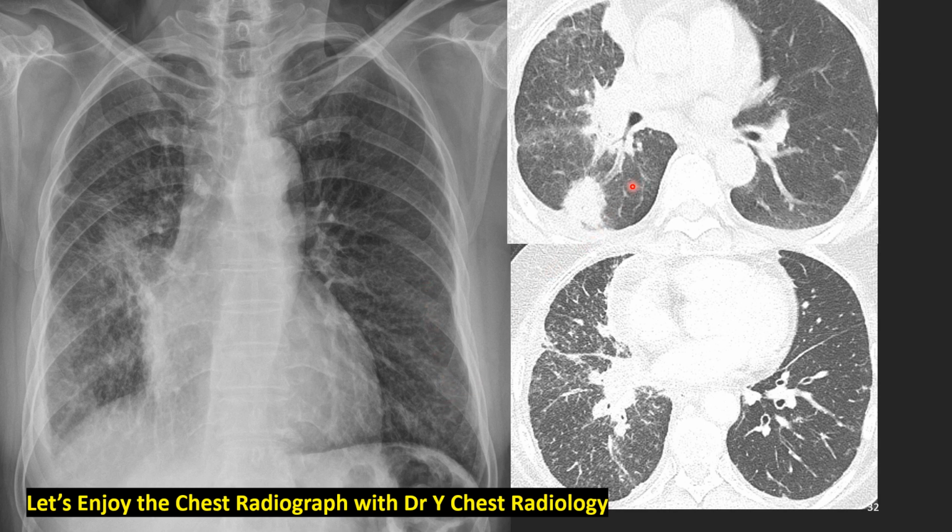Let's look at the CT. Actual image of thin section. Right lower lung cancer, bronchovascular bundle thickening of lymphangitic metastasis. Look at the normal left side. This is normal. And how about the lower portion? Yes, this is the mass, including lymph node, with bronchovascular bundle very thickened. The left side is normal.